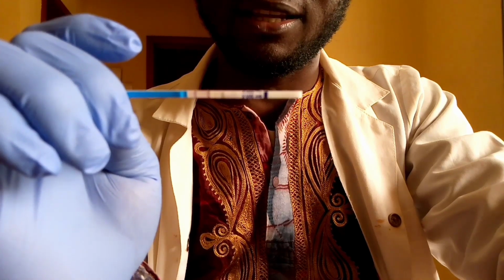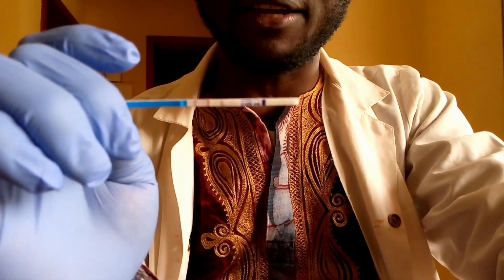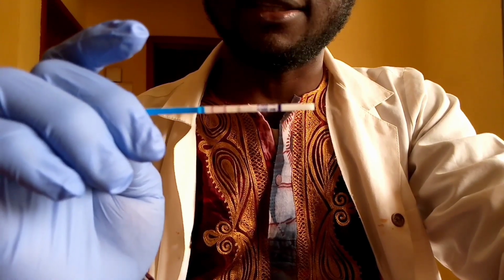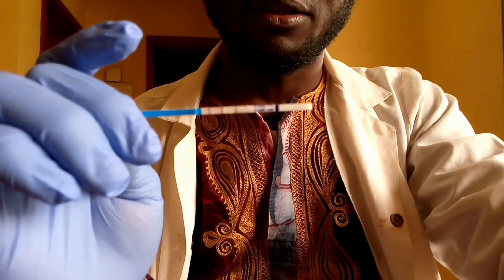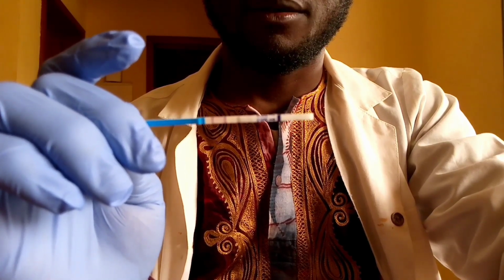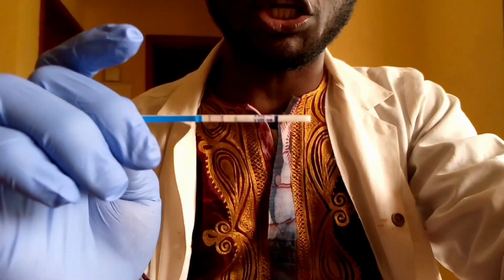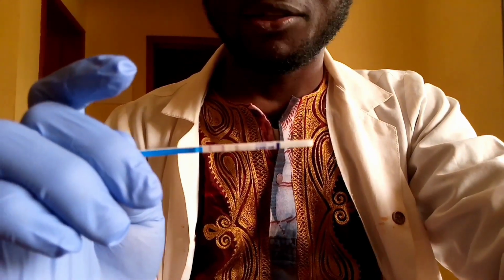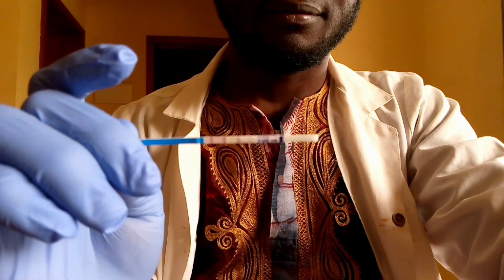So let me explain why we say for ovulation, the test line does not necessarily mean that you're positive if you just say it. And what is the implication if you are positive for ovulation? Does it mean you're ovulating? So let us explain that.